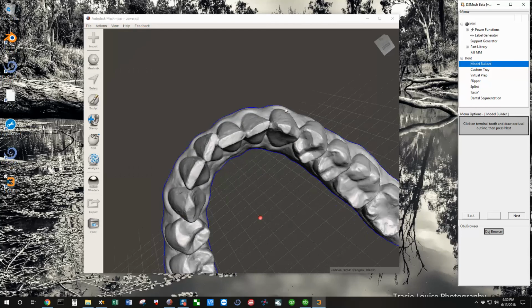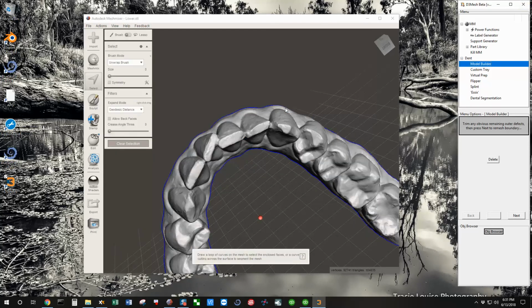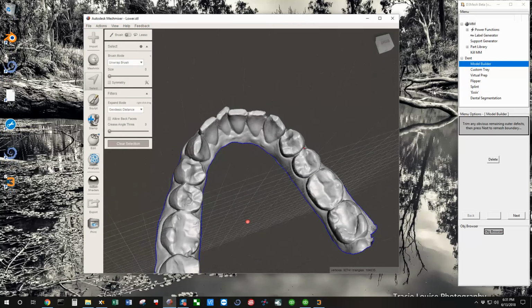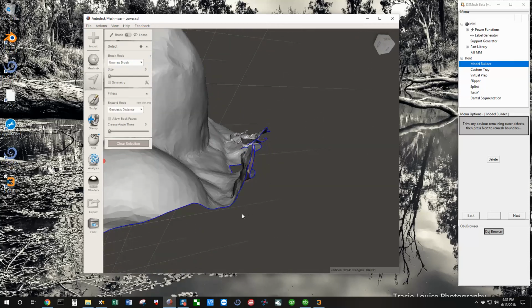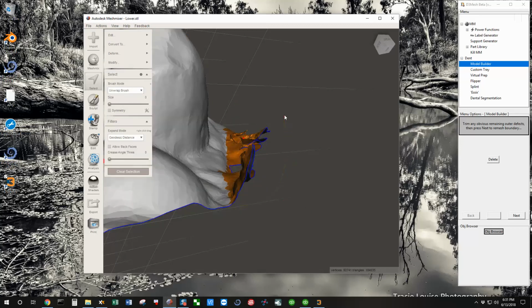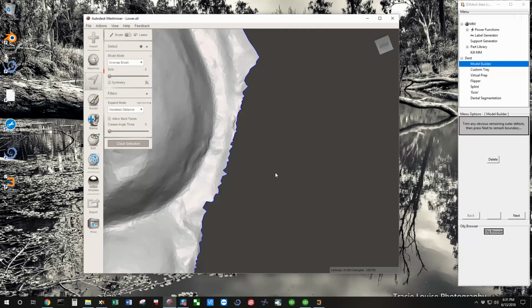It's going to go through a number of steps in preparing the model for you. Now you get one last chance to come out here after it gets rid of all that and remove the tiny defects, artifacts that you want to get rid of. So right here I see some. I put my cursor right there, zoom in, and hold down the left mouse, circling what I want to undo. Mesh Mixer sometimes will do that, so you go back the other direction and it picks it right up, and then hit the delete key.